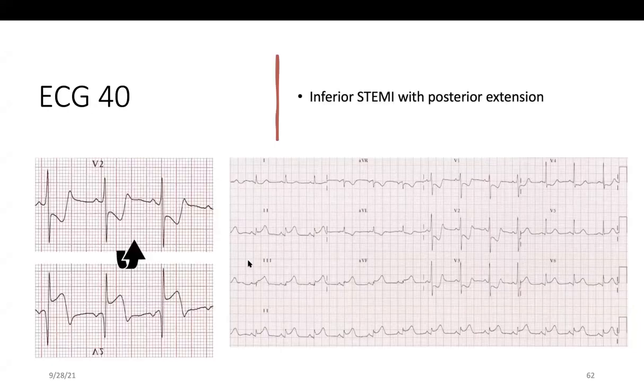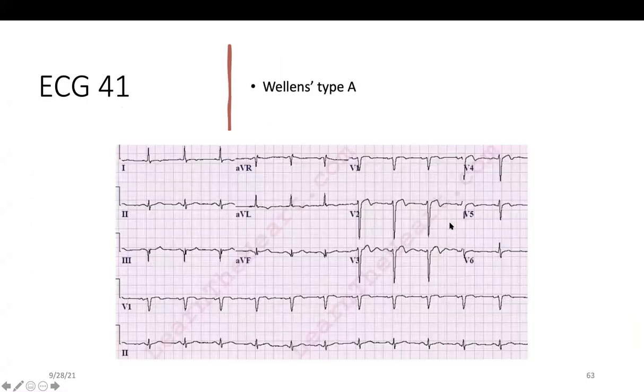Again, you know, لاحظ الاي سي جي V2 إذا قلبتها هتعطيك الريل بيكتشر. هذا الويلنز اللي دائما يقول ويلنز. This is a Wellens syndrome. Do you see a Q wave? Even in V1, you see a small R. Okay, and the biphasic T wave is all over.